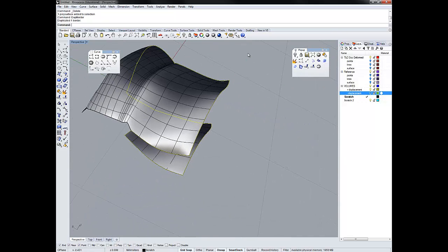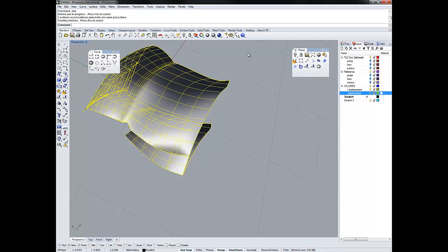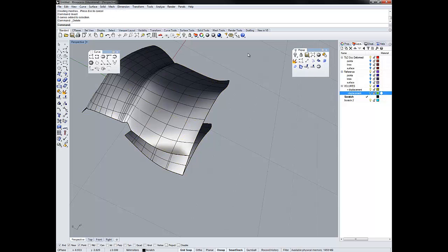All right, so this large region is going to be very interesting. Let's do this part right here so we can close that off. So I already deleted that line by accident. That's okay. Left click, and then we split this curve by that. I'm then going to select this curve, and I'm going to explode it. And it explodes into 3 segments. Add the 4th, and then select surface from 2, 3, or 4, and rejoin 2 surfaces into 1 open polysurface. Invert, delete our curves, select it again, duplicate the borders, and we see that we are good.